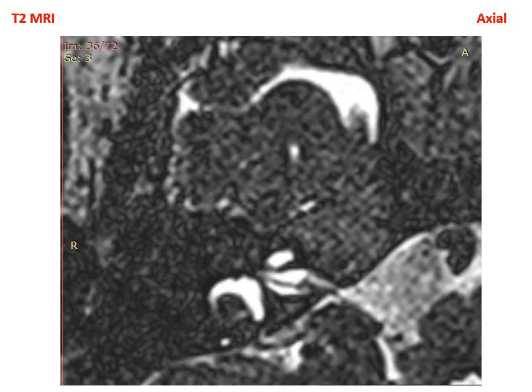Moving a little down, we will start to see the vestibule as well as the lateral canal, the lateral semicircular canal, as a signet ring appearance. As we can see in all structures of the vestibular system, the fluid is high intensity signal, and this is the advantage of looking with a T2 sequence.